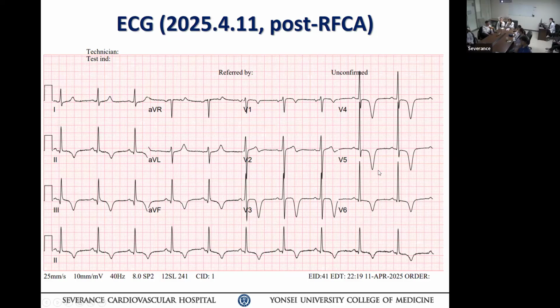Absolutely no. How should the T wave look, guys? Normally it looks upright. Yes, there is T-wave inversion, but the coronary angiogram was normal. So something happened in this patient.